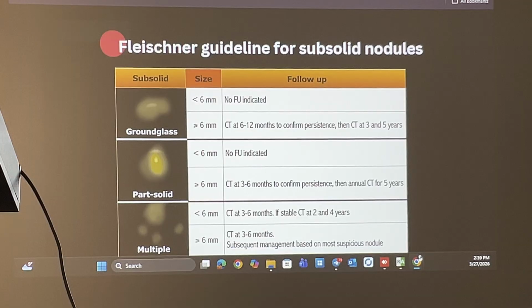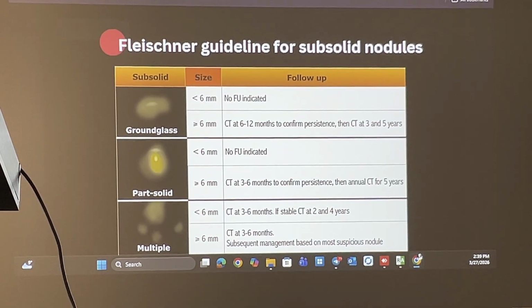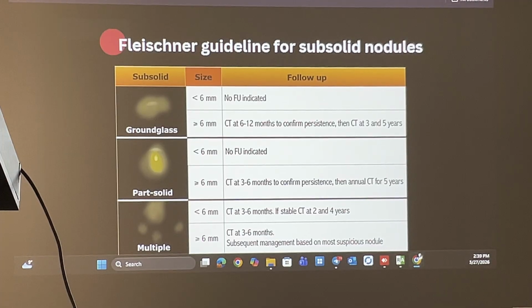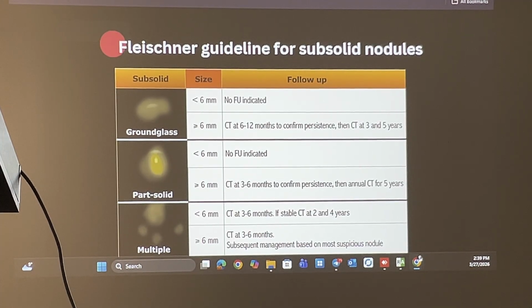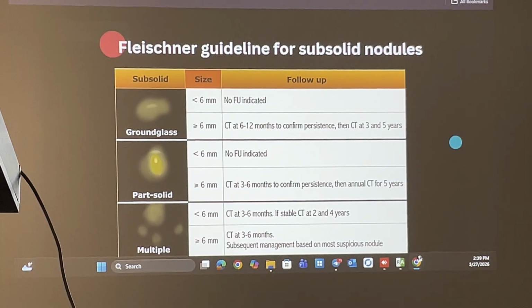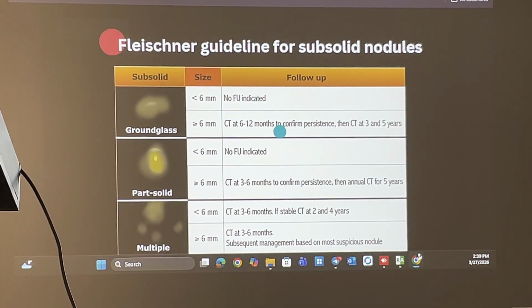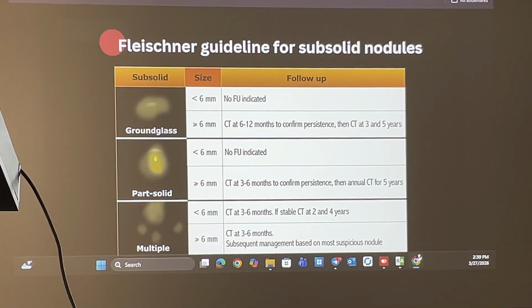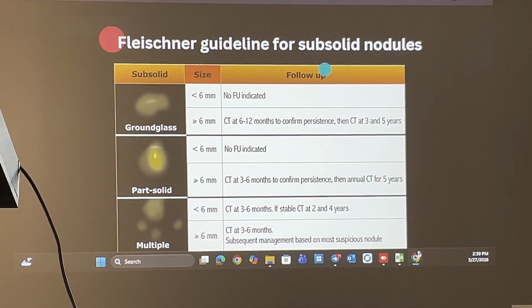And when you see ground glass opacification, that is a higher density than the surrounding tissue, but not obscuring underlying bronchovascular structures. The Fleischner Society pulmonary nodule recommendations pertain to the follow-up and management of indeterminate non-calcified pulmonary nodules detected incidentally on CT scans and are published by the Fleischner Society.